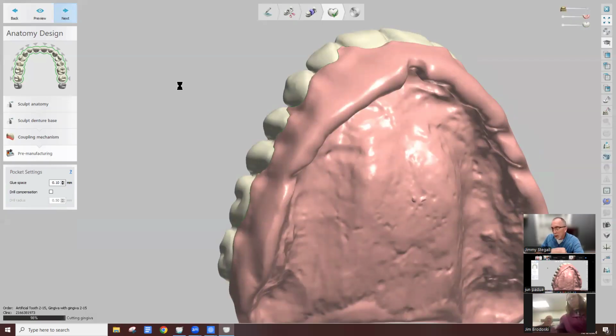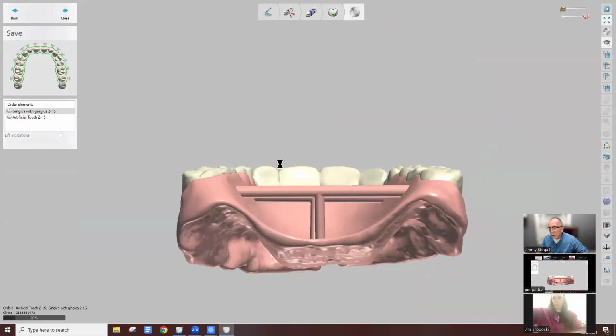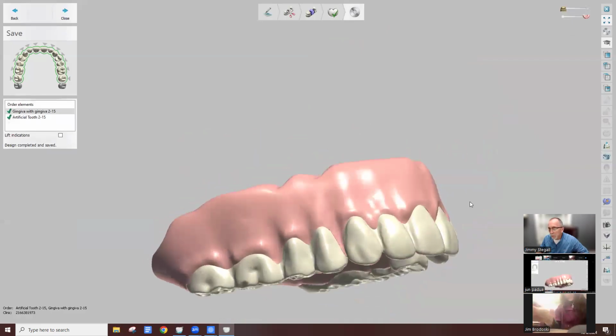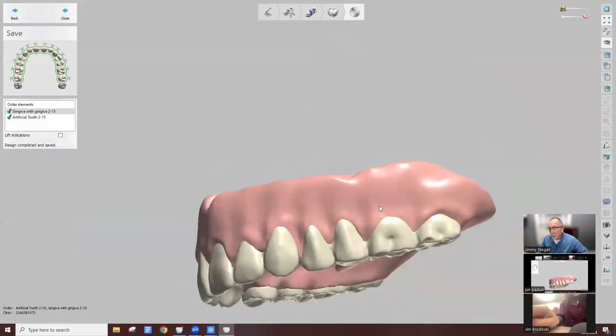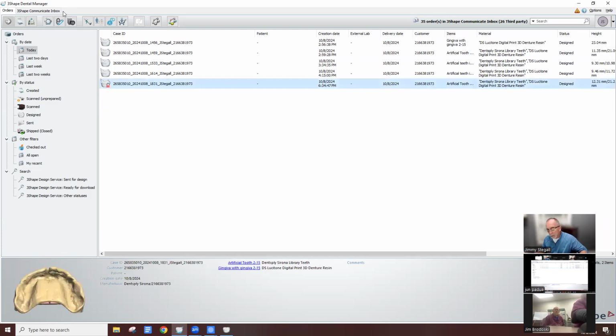The challenges with Copy Denture come into play when there's not a clear definition between tooth and denture base. If it's a really old, worn down denture, and it's too smooth of a transition, sometimes 3Shape really struggles with seeing that and generating the separation. So drawing the lines around the segments can be a bear sometimes if you can't see that. That's why I will sometimes take that modeling tool and create a little margin on the scan of the denture.